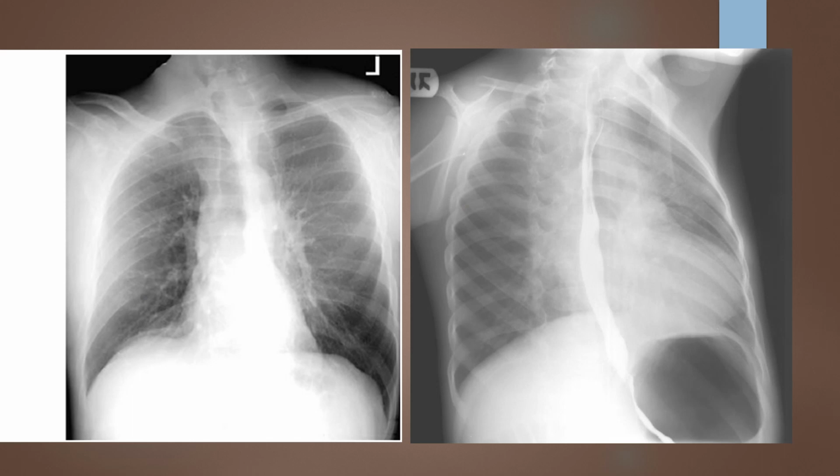So if we look at these 2 images, I can look right off the bat at this image. If this is a true oblique chest, I see that all my anatomy is here. I've got apex to costophrenic angle to apex, so all the anatomy is included. I can check that one off my requirements. Secondarily, I wanted to check my technique. Do I have adequate tissue penetration? Do I have soft tissue detail, bony trabecular pattern, adequate lung markings apparent?